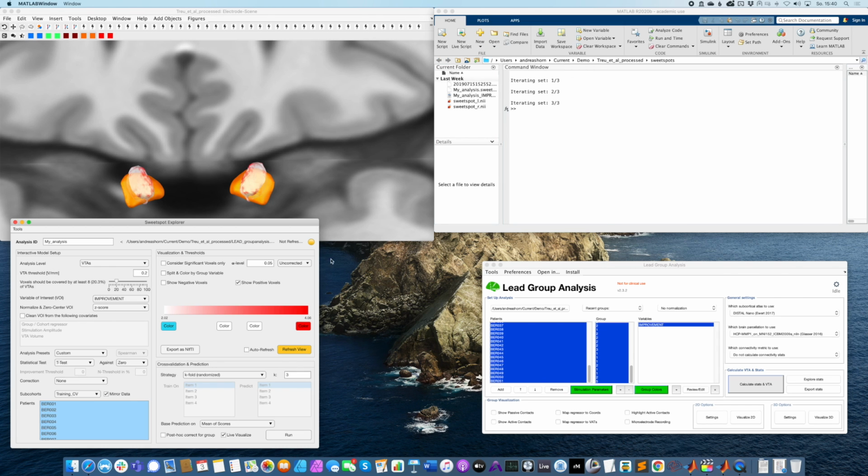And finally, if at some point we would be happy with this, since we created, remember, the training and test subcohorts, we could now say we want to train the model on the training and cross-validation set and predict the test set. And that would be the very final step.